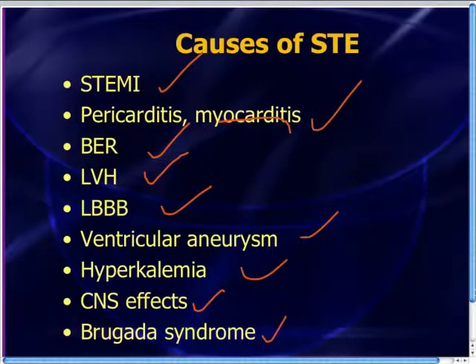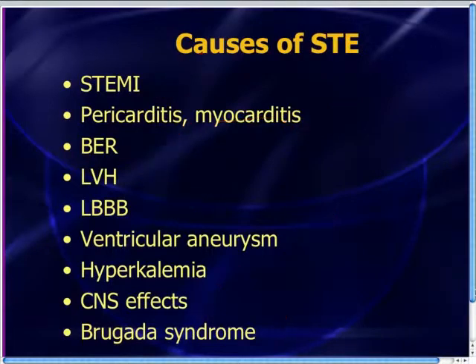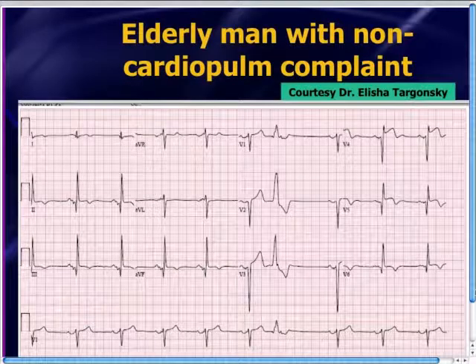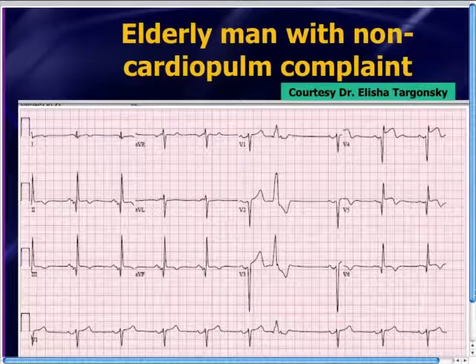For those people that might be new to the EKG videos, by the way, if you don't have any idea what I'm talking about with regards to syphilis and electrocardiography, you just need to go back a few weeks and you'll learn how syphilis relates to electrocardiography. Go figure. So anyway, that's a pretty good differential for ST elevation on the 12-lead. There might be a few other things as well, but these are the things that certainly jumped to our mind initially. And going back to this 12-lead EKG, we can start knocking out some of the things from this differential.